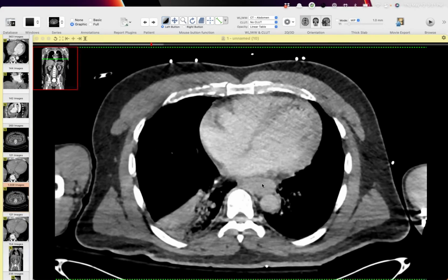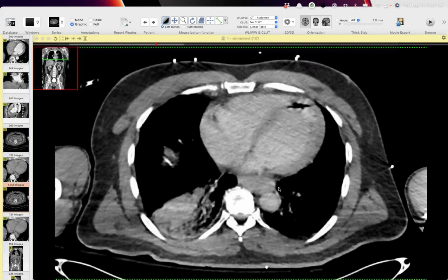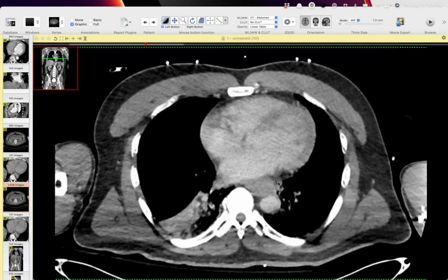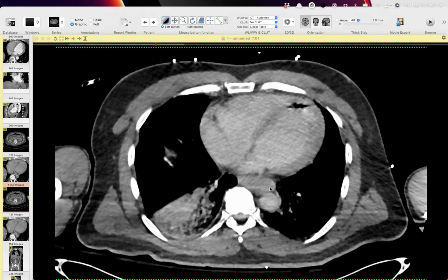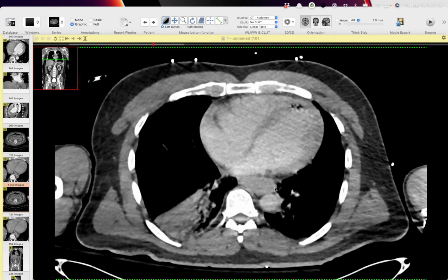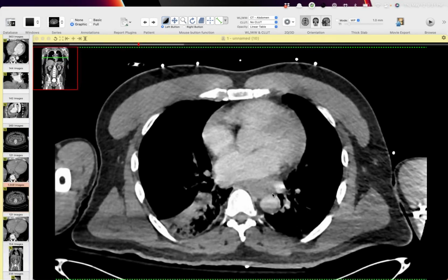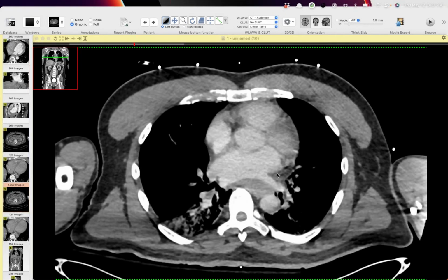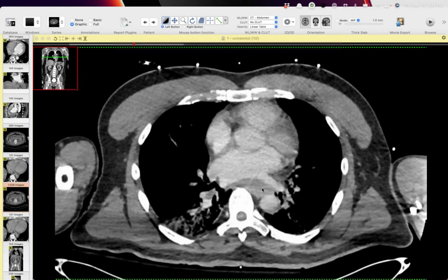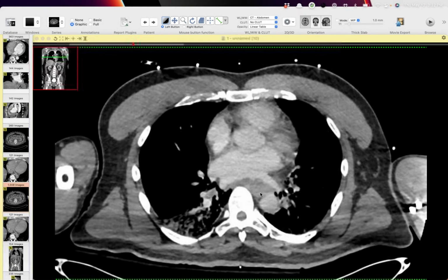And with the dilated esophagus, I don't know why it's dilated all the way down. That actually is unrelated to what this is. I don't know if it contributed to this complication at all, but this is a patient that did in fact have an atrial ablation for AFib about 4 weeks prior. So atrioesophageal fistula, of course, is the most feared complication, unfortunately rare, but usually happens 2 to 4 weeks afterwards. And the presence of the air there, even if you can't see a direct communication, is virtually diagnostic. But in this case, you can see there's even this extra fleck of air right there, kind of indenting into the left atrium. So it's hard to see what's actually esophagus and what's left atrium.